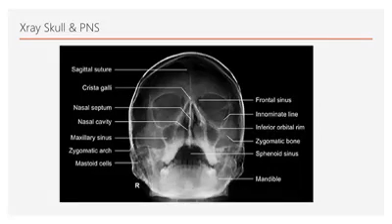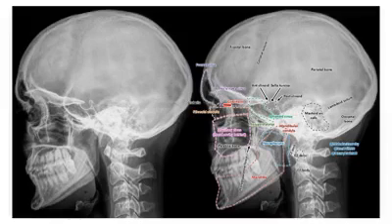Another clinical question which may come, from the paranasal sinus obviously, is where the paranasal sinus opens, and what are the functions of the paranasal sinus, like what is the function of the maxillary sinus. And now let's study the X-ray of the skull from the lateral view.